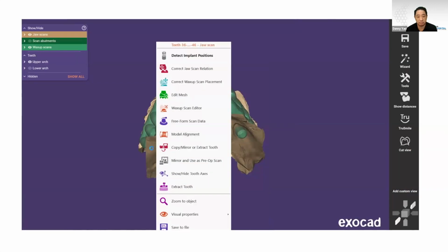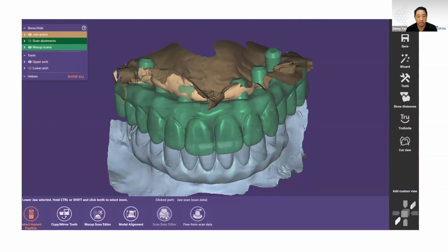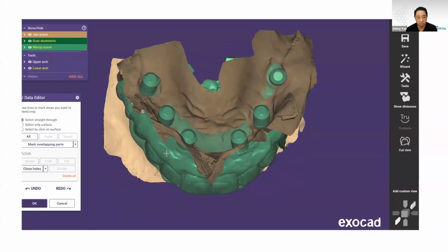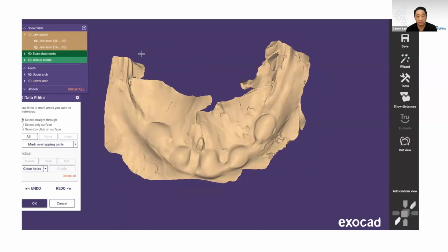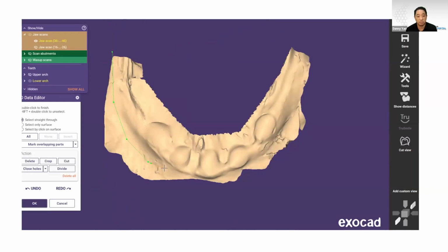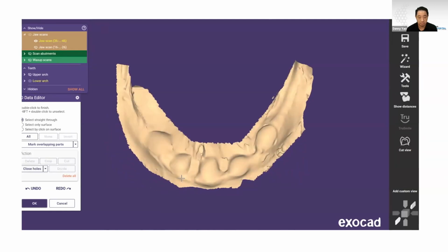We can see there's a little bit of extra data that isn't really needed around the edges. Everything that's not right underneath the prosthesis design just isn't needed. So we're going to trim out the palate of the upper and the lower, so the STL files and our design are a lot cleaner when we actually do the intaglio surfaces. We're just cleaning up and trimming out all that stuff. It's just a good practice in general when you're designing your prosthesis.